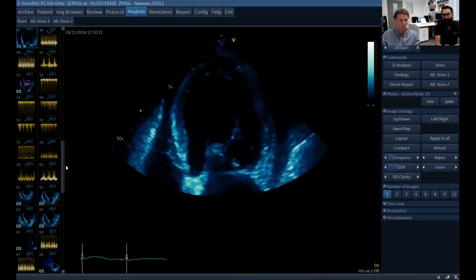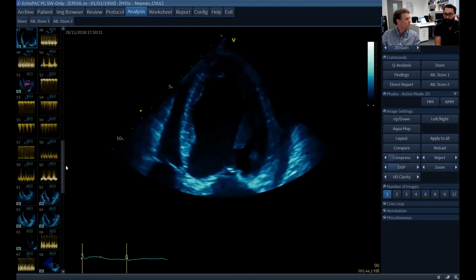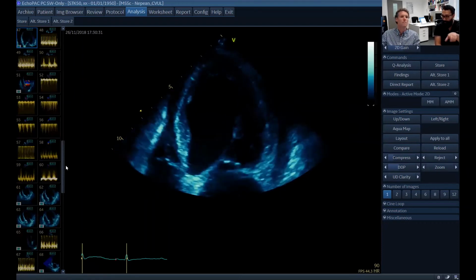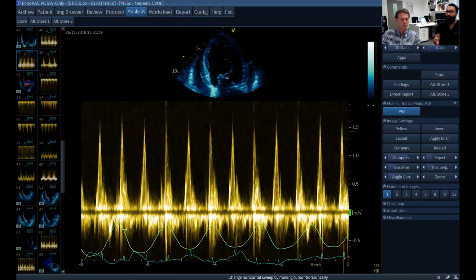And probably the last thing, just to be specific, is expiratory increase in E-wave velocities in the left ventricle, and inspiratory increase in the right, and this is describing an exaggerated version of ventricular interdependence. That happens all the time, but when you've got fixed elevated intrapericardial pressures, then the septum bounce is exaggerated. So I think here, because of the LV being dilated and cardiomyopathic, we've got essentially two coexistent properties which are causing the patient to be a lot more short of breath.